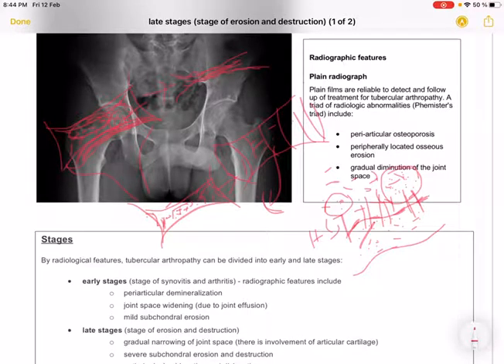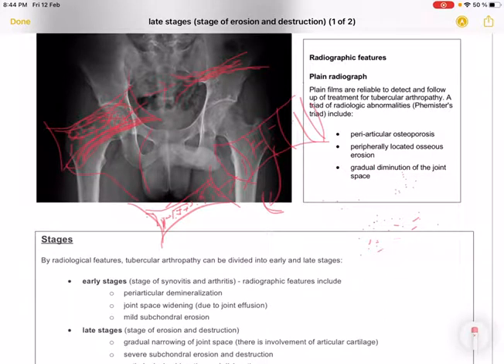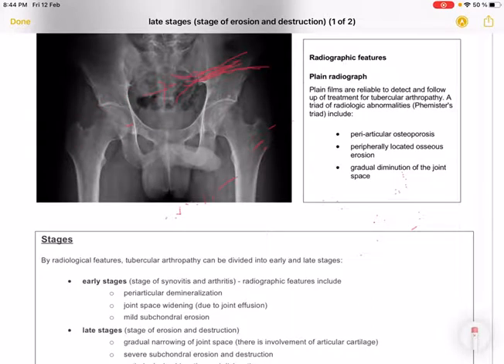So the same thing happens whenever there is inflammation of the joint. In this condition, the joint space becomes reduced. So why not increase, why not widen? Because it is no more in the acute stage, it is present in the late or chronic stage, that leads to narrowing of the two joints. If it is the early stage, we can see a widening of the two joints, and on physical examination there will be pain, swelling, and a reduction in the movement at the joint.